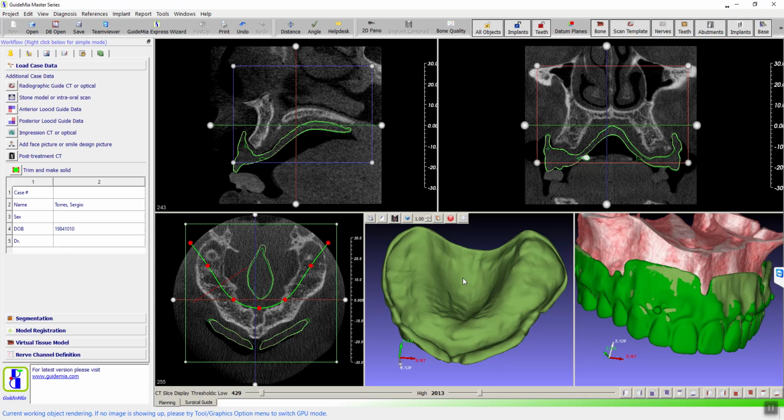Why do you think the markers are going to cause a problem later on? Because we're going to recommend the SureMark markers. Yeah. Okay, let's take a look.